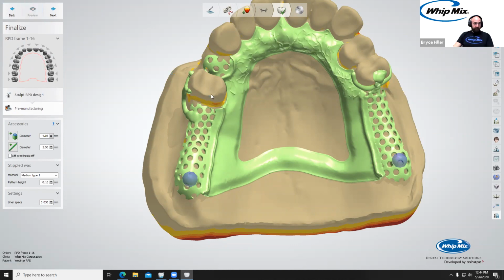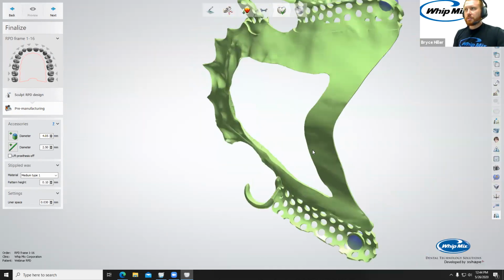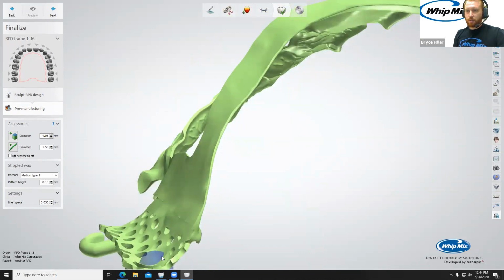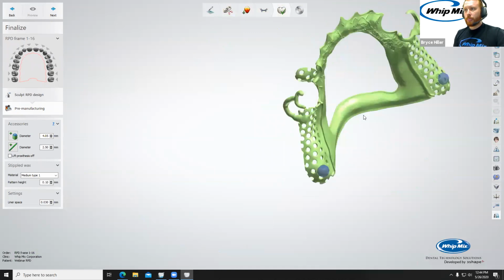Now this is something for those that have not seen this. This is something that has been added to the tissue stops for, why can't I think right now? For custom impressions. Yeah. Which we are doing here in a couple weeks. Yes. So now you can see underneath we have tissue stops here and here. So it's kind of cool.